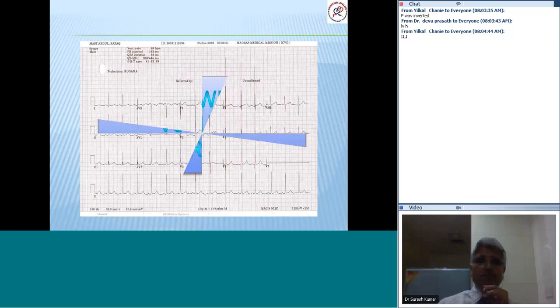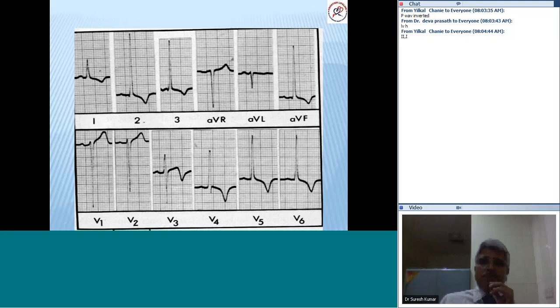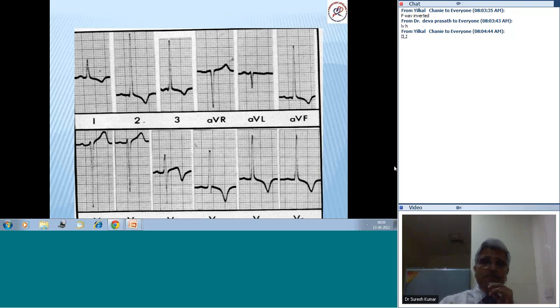Now see this one. What does this show? Give me a response quickly. Do you hear me?